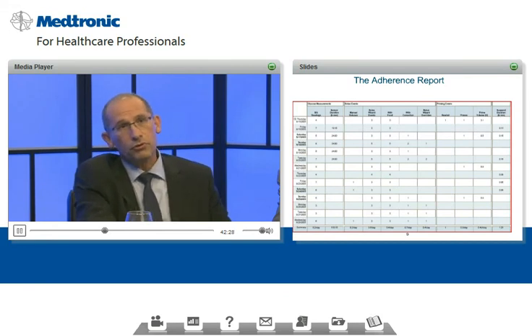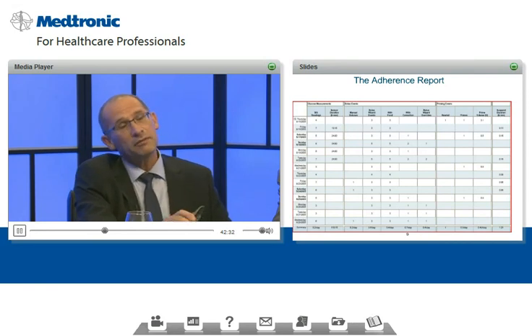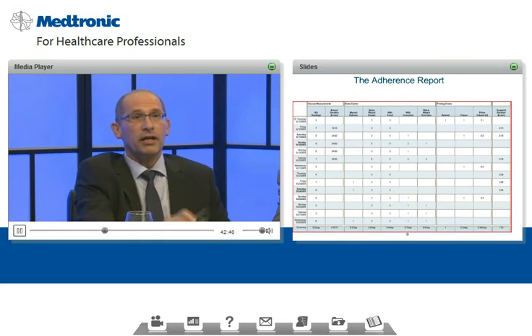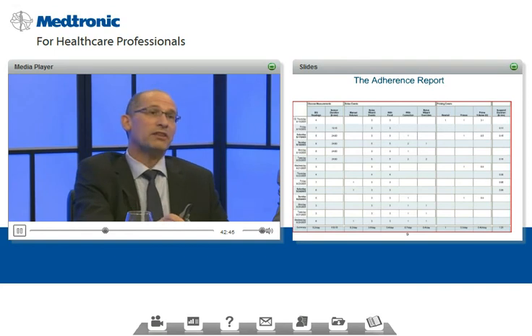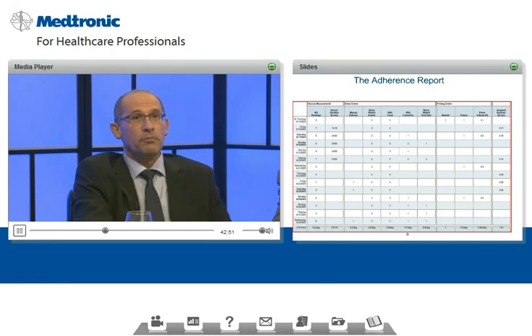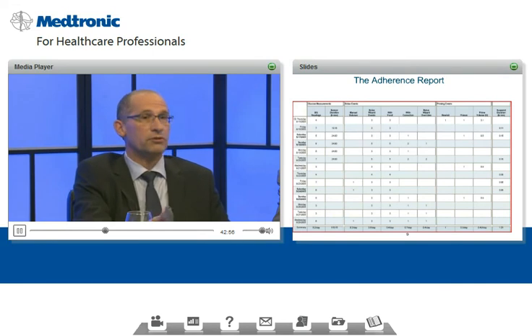We'll continue to the other part, and that is the priming events, because that gives us a hint on how good the patient is at utilizing the consumables. Every time he's changing the reservoir, we'll have a hint at the rewind. There will be another number in the rewind column. In this case, we can see that he's not changing the reservoir. Something is wrong here. When the primes are on, that means that probably the patient is also changing the catheter.